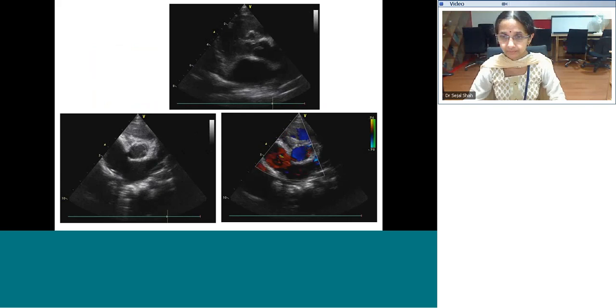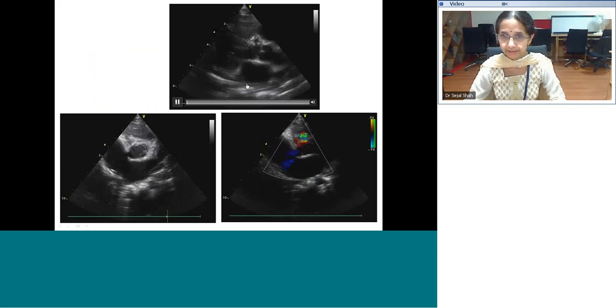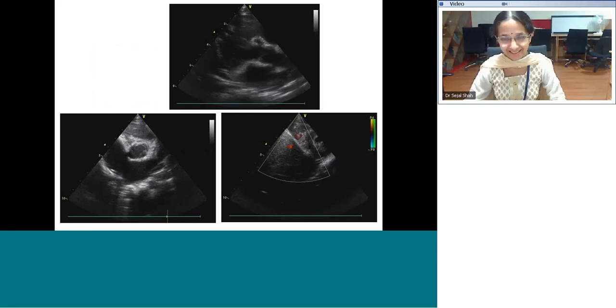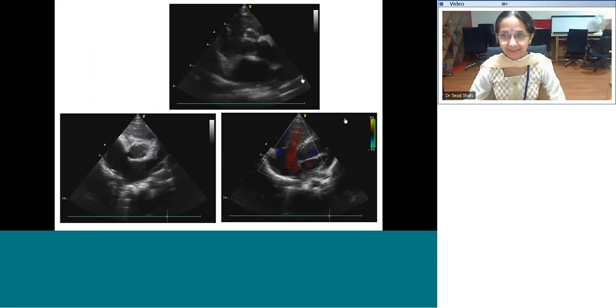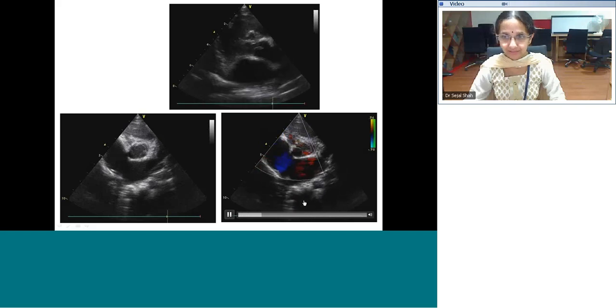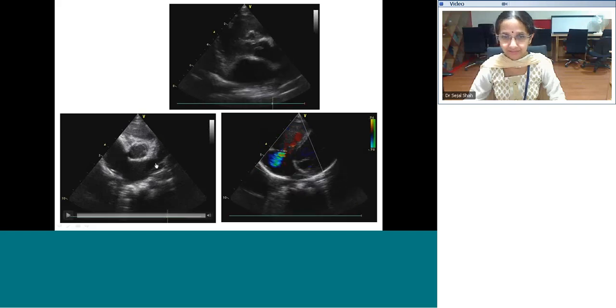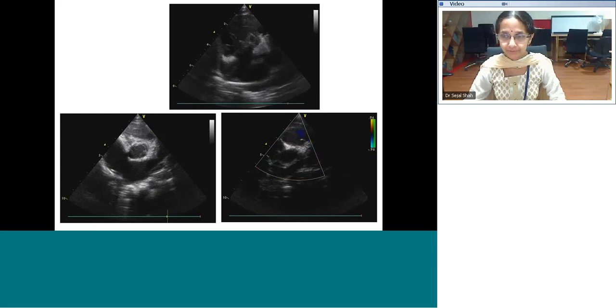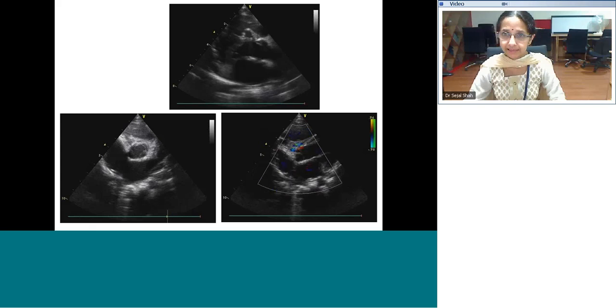I'm sure all of you will agree that this is a very easy diagnosis. Okay, Nidhi, can you see that last image once again? Can you see this, the long axis? See, the sinus is a structure which is above the aortic valve.